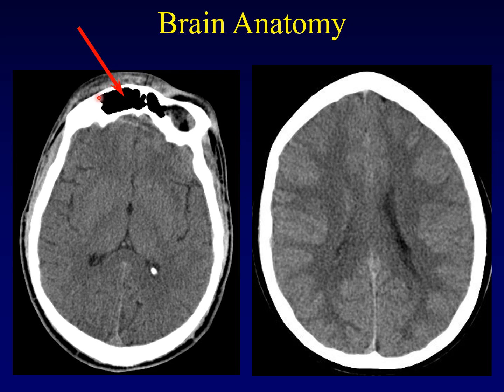Well, what about this dark object right there? What's that? Well, there's dark and then there's dark. I mean, yeah, the CSF is dark, but that is just as dark as the air surrounding the patient. That's because it is full of air. And this is the frontal sinus, right? It's supposed to be filled with air. And those are the paired frontal sinuses in your forehead.